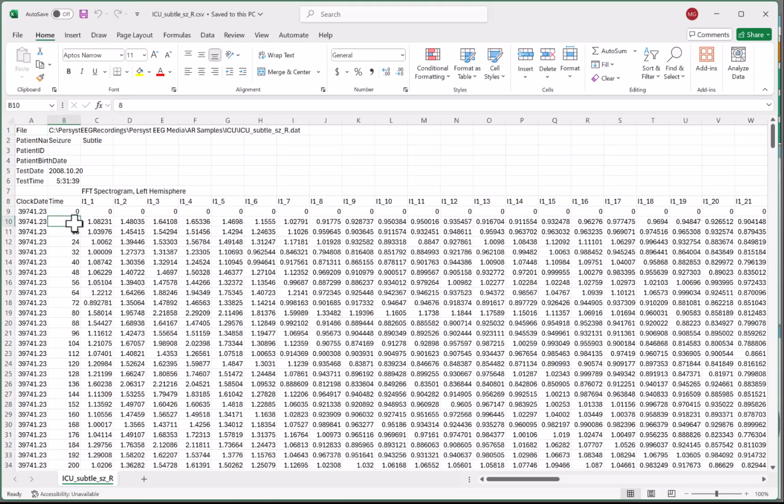So this is going from the beginning of the recording, that's time 0, and then we're jumping in 8-second increments, and then what we have here is each frequency bin according to the FFT parameters. And these are microvolt values. Over here is Microsoft OLE time, which gives you clock time. It encapsulates both day and time. The fractional part is the fraction of a day after midnight.